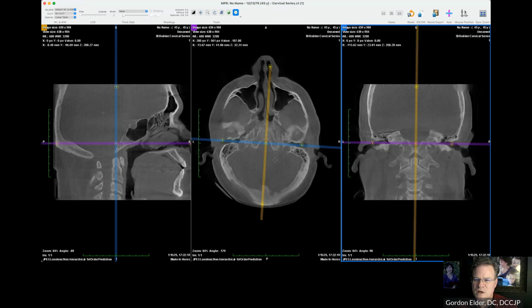But if you're going to use angles off of these CT scans, then you need to have some reference points, and you need to have an external reference, because when you walk up to the patient, they're laying on your adjusting table and you're using your protractor or whatever else you're going to be using to measure how you're going to address that joint, it needs to mean something. Okay. I mean, if you're sloppy, you can take a measurement off, walk up, and it has nothing to do with how they're made inside because you don't have any reference points.